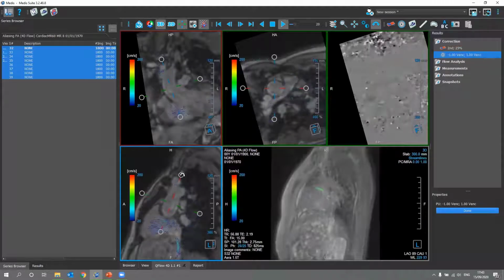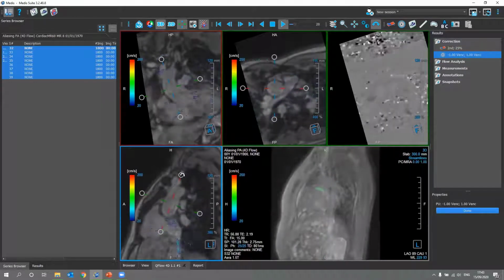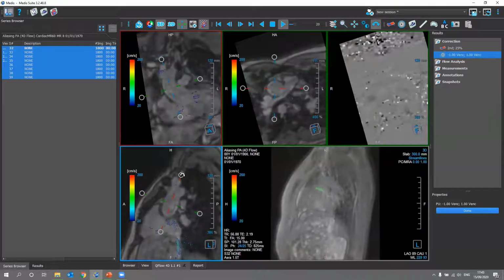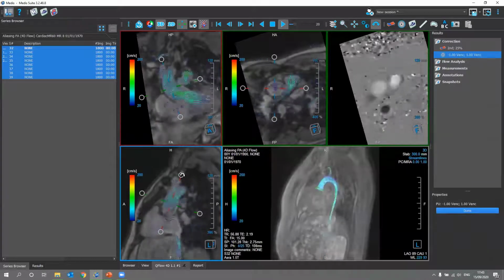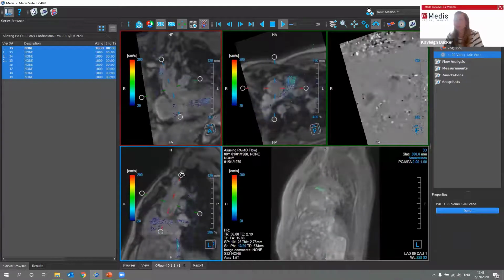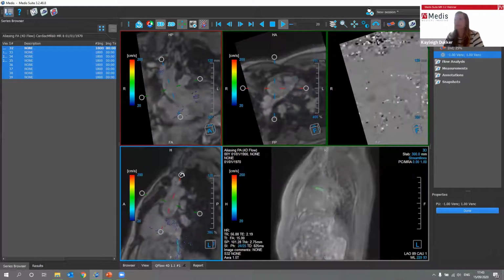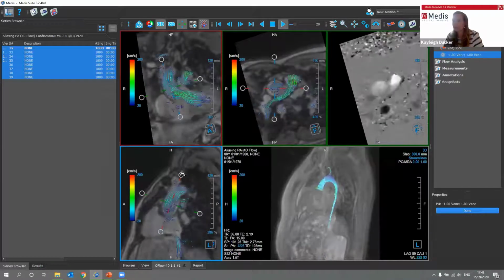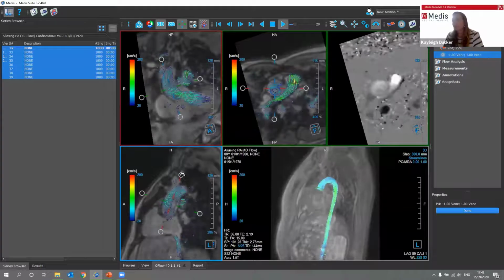Katie, there's a question now. Should you always use the anti-aliasing unwrap button even if you do not see any, or is there a downside? So wonderful question there. You can, if there is none, then it won't do a lot. It will check the data set, but won't change a lot.